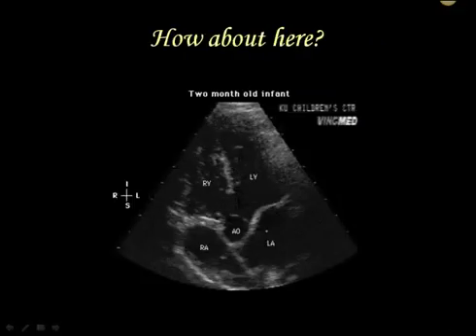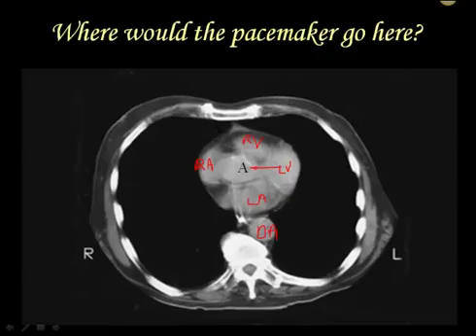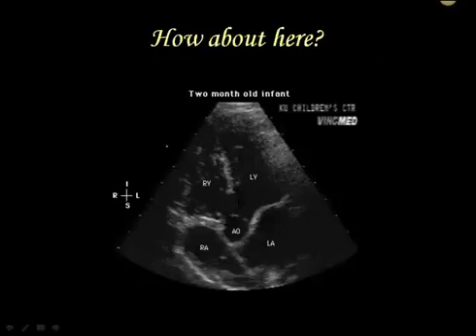How about here? Okay, what have we actually got going on here? Now, you don't see much of anything here, but where would a pacemaker go? Well, we've already talked about the fact that pacemakers go to the right ventricle. How about in here? Well, we would expect it to go from the right atrium into the right ventricle.